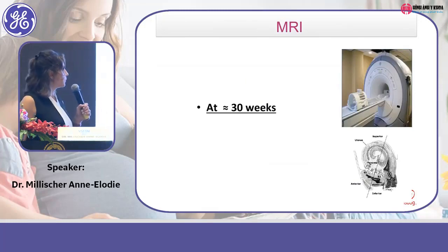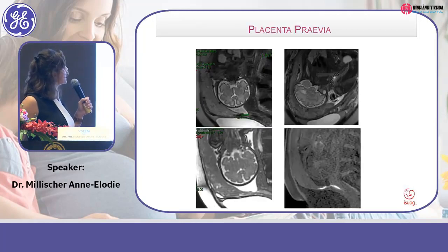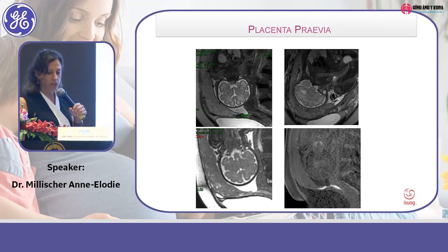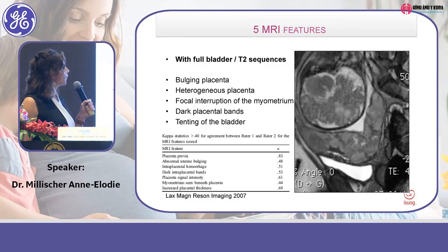We'll go through MRI rapidly, just to know the aspects that it can show. The placenta previa is correctly diagnosed with a very reliable measurement of the location of the placenta and the internal orifice. Và bây giờ mình sẽ khảo sát bánh nhau trên cái hình ảnh MRI. Thì cái hình ảnh hồi nãy cô cho thấy là cái bờ bánh nhau nó cách cái lỗ trong khá là gần. We have this quite parallel semiology of the diagnosis of placenta in MRI.